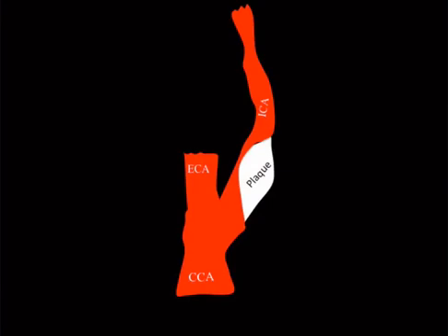Okay, so last case. This is just a refresher on the North American Symptomatic Carotid Endarterectomy Trial, or NASCET, how you do measurements. So if you've done this in residency, you've probably done it a bunch of times. If you've not done it, if it's something the fellows do or you guys don't do, I'm just going to review it real fast. So there's a calculation that's done to grade the stenosis in the ICA for the purpose of risk stratification for surgery. And as you would probably imagine, you will measure an area of maximum stenosis here and then an area up here somewhere.